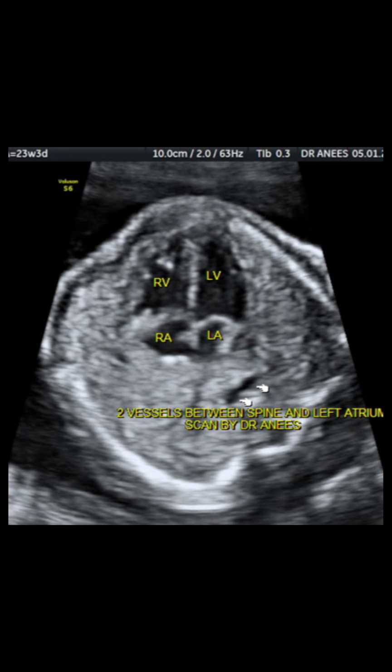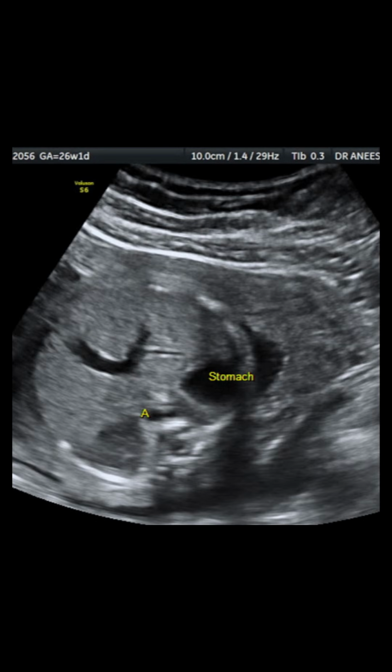The cross-section of 2 vessels instead of a single vessel, that is the aorta, is seen between the left atrium and the spine. The third case of abnormal visceral situs is seen in picture 8.